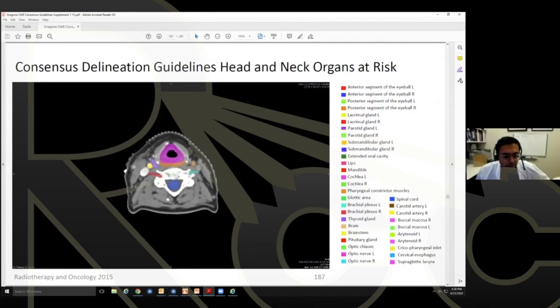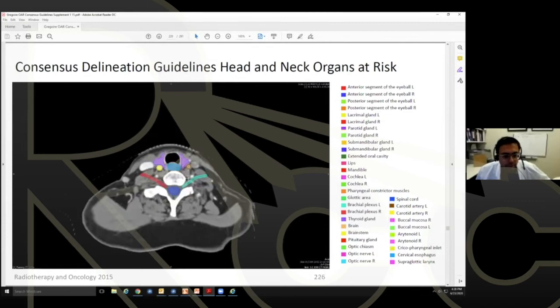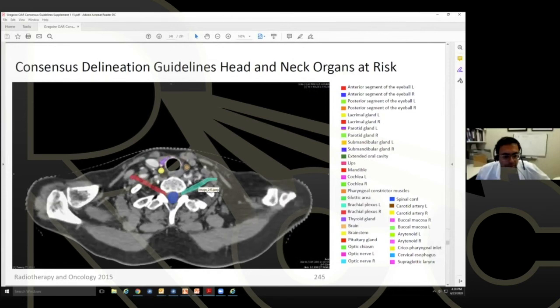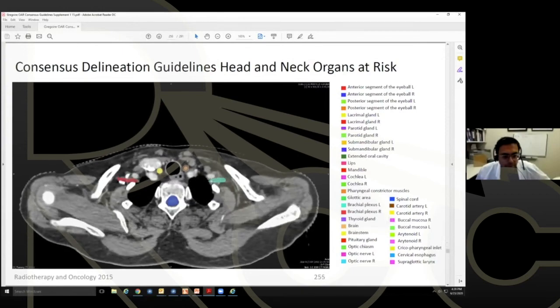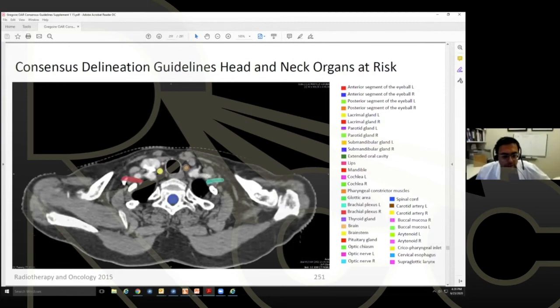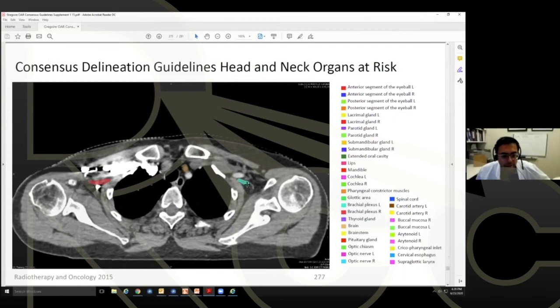And then you go down, and then as the foramina opens up again, you have the nerve root connect back up here, and then you keep repeating that. Now, as you go lower down, this is where the brachial plexus starts following posterior lateral to subclavian. Okay, this is the T1 nerve root right here, and now is extending posterior lateral to the subclavian. You can see that space right there.